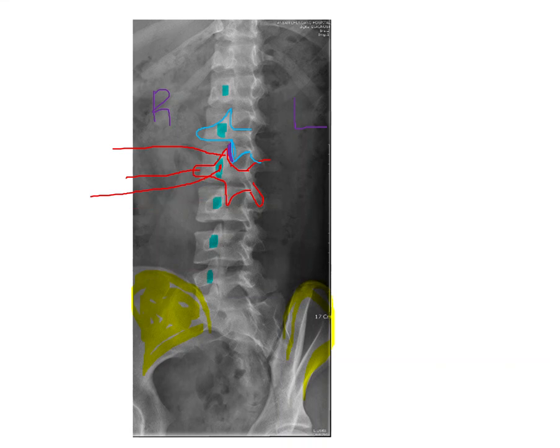Also, we can talk about over and under rotation very briefly, because we will follow the pedicles to see if our patient is over or under rotated. So usually our routine positioning would be a 45-degree oblique. But if we look at our image, the pedicles should be relatively centered in the vertebral body, right?